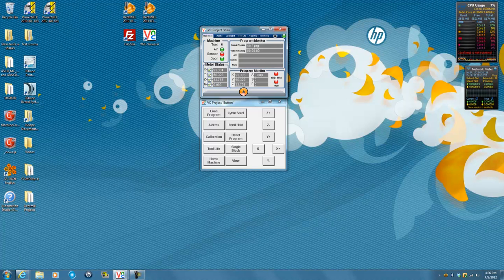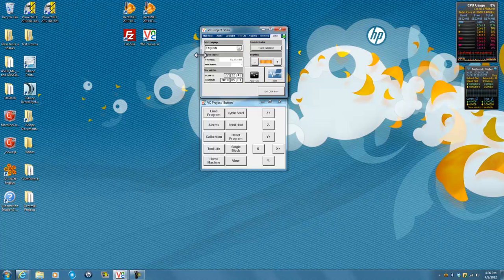When you click the Setup button, you can see under Network Settings, the machine has an IP address. This is generated by the router at your office. So each machine will have a different IP address, but we're going to need it for connecting and file transfer. So I can see in this case it's 172.16.20.111. In order to transfer CNC programs to the CNC milling machine, I'm going to use this program called FileZilla.